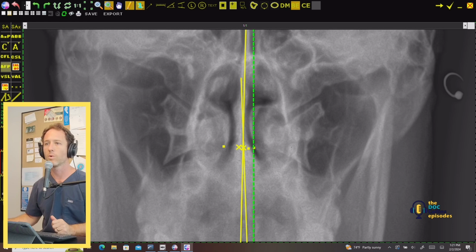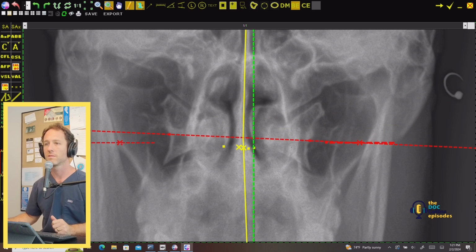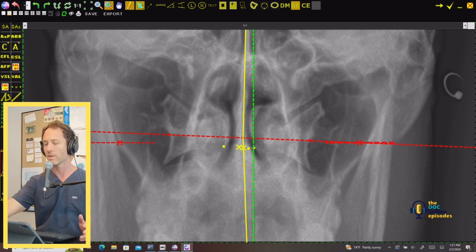And if one of them doesn't agree, you kind of kick that out, even if it is that inferior aspect of posterior arch, which historically is weighted as the measurement. But let's say 3 of those lined up and that measurement is asymmetric. Well, you have to give an opportunity for genetic variance there, right? It's not truly the atlas plane, which may be based on the superior tips and inferior tips and superior aspect of the posterior arch.